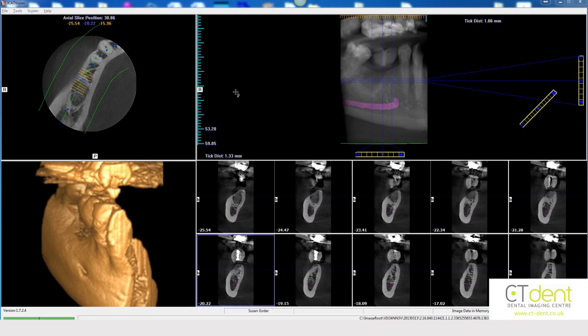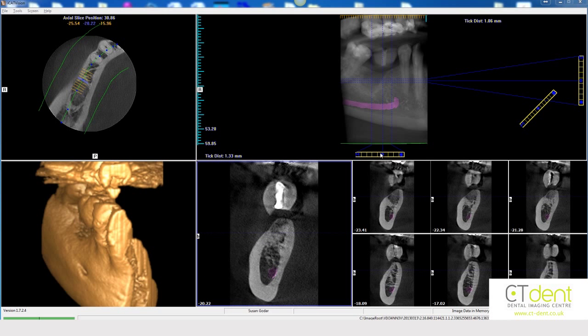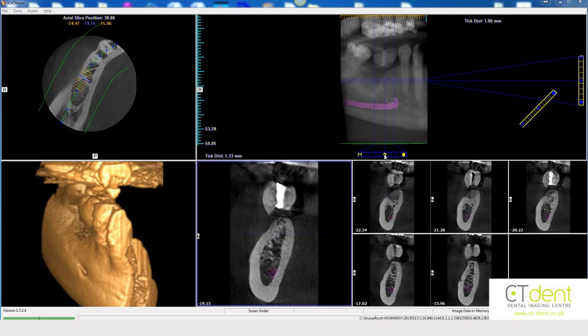Although our technicians will align the scan orthogonally to the regions of interest, you may still have to drag the horizontal bar to scroll through the cross-sections to optimize your preferred viewing. If we use the central reference slice, which is highlighted by the purple outline and situated in the bottom left-hand box of the two rows of cross-sectional images, this can be magnified by moving the cursor to the very right, and using the zoom function, and measurements can then be made.